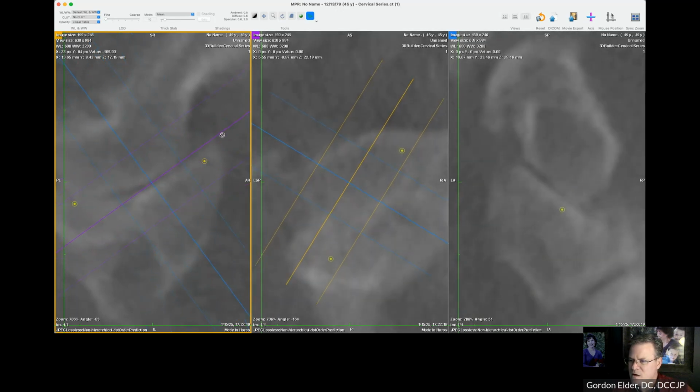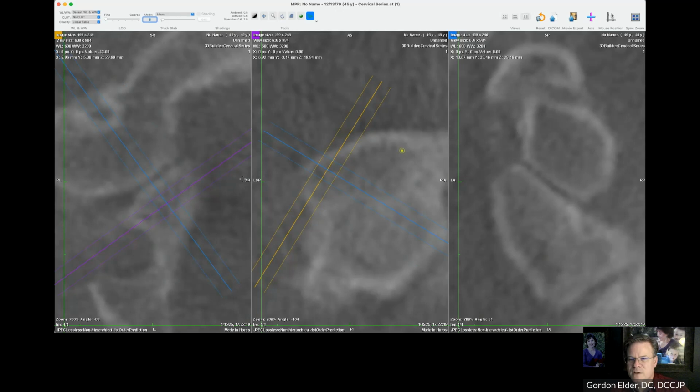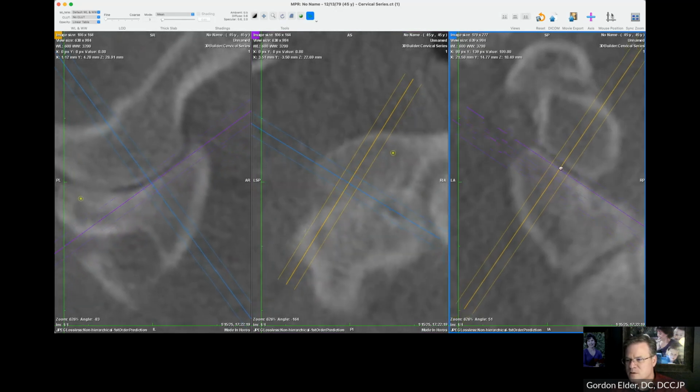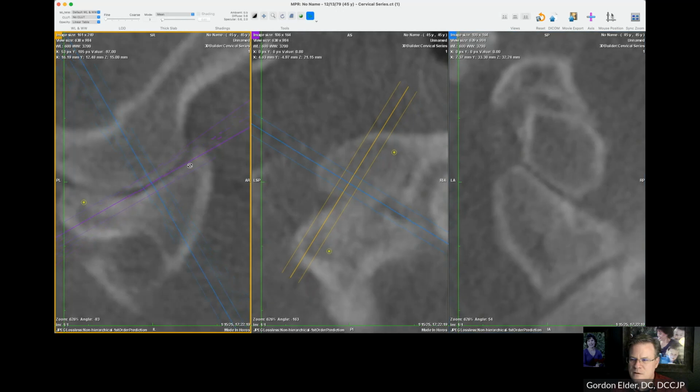Oh, look at that. Okay, so we come up to there. Now, if we look at that, that looks pretty even. We're looking at the skull coming down, but let's go down to the 3 and see what we can see. All right, let's just get all our lines in the right spot. It tends to want to move around a bit. Good, good.